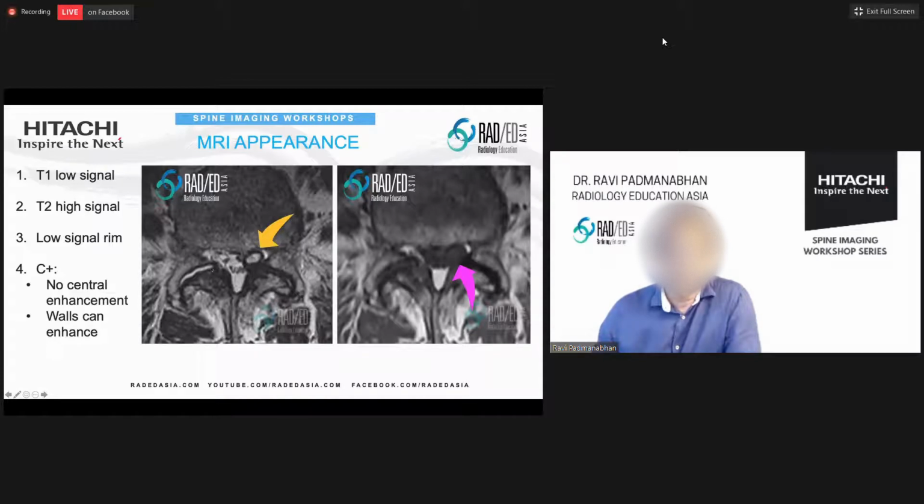Here we have fluid in the facet joint. The things that give us some indication that there's degeneration in the facet joint is the fact that it looks a little bit too much, and it also looks asymmetric. So the previous one we saw, the normal one, was very symmetric. Here we've got significant asymmetry in the amount of fluid. So this looks like there's a bit too much fluid in here.